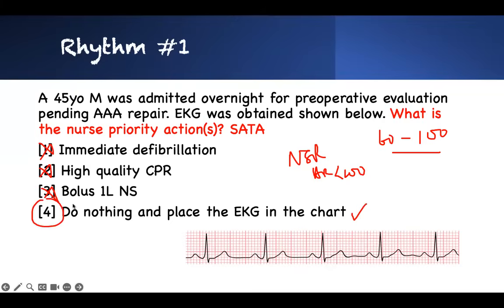So this is normal sinus rhythm, everybody. Most people have normal sinus rhythm unless there's anything wrong with the heart. And when you see this, you should not call the doctor. You just put it in the chart. If you see anything worrisome, yes, but calling the doctor for this is the wrong move. You ask yourself, is it normal? Yes. So this patient does not need anything. Put it in the chart and do nothing. Sometimes it's difficult for us not to do anything, but this is what you do. So that's the first question. Normal sinus rhythm. We've got to start from there.